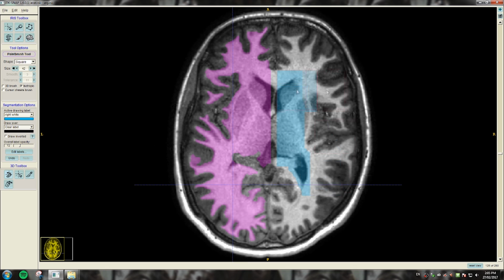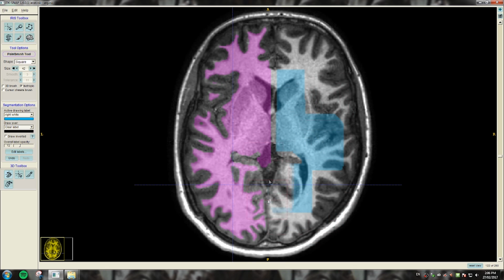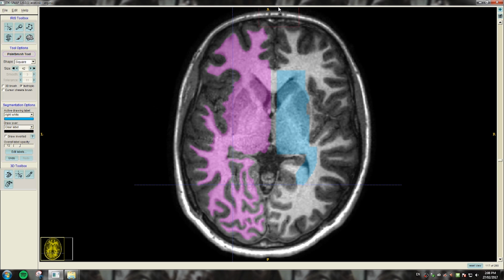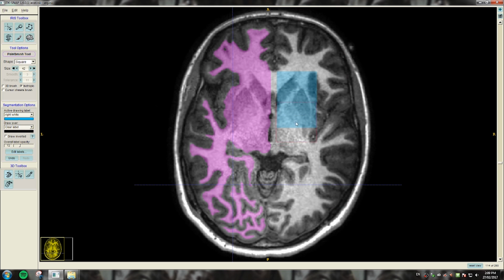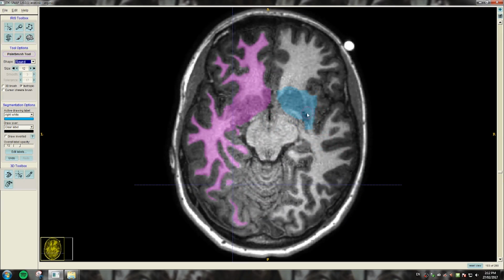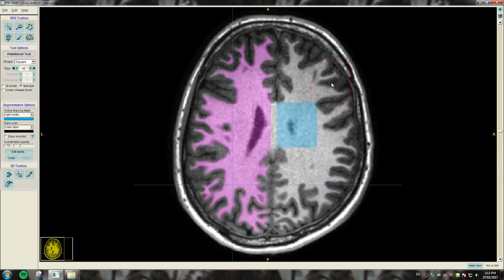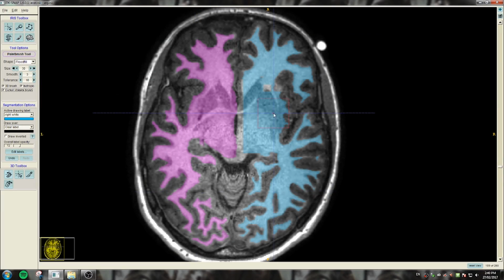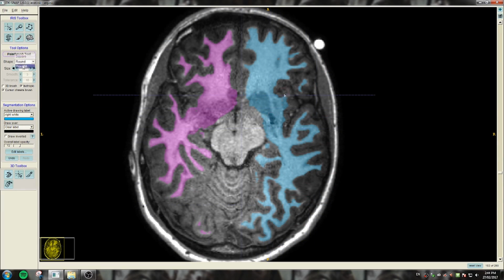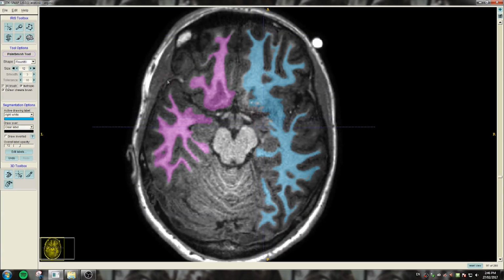So fill in using the flood fill brush and the 3D brush in axial view. And then after you finish doing that, smooth it once or twice, and then fix up the back of the head across all 3 views. So axial, coronal, and sagittal. So after you've done that, if you want, you can smooth it. Otherwise, start fixing up the handles.